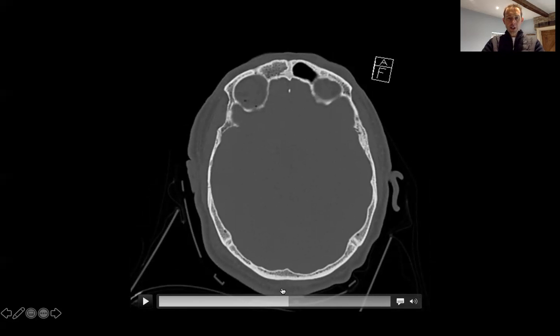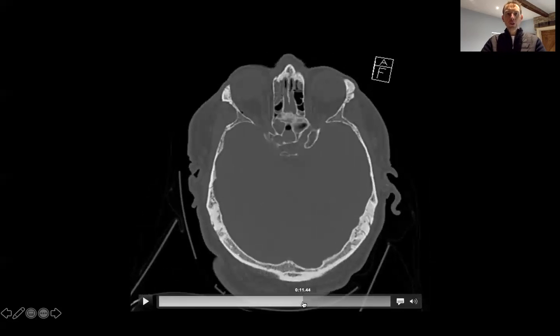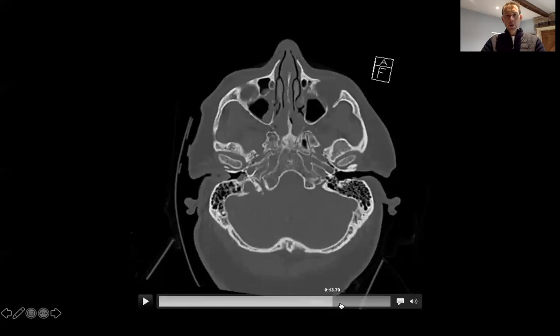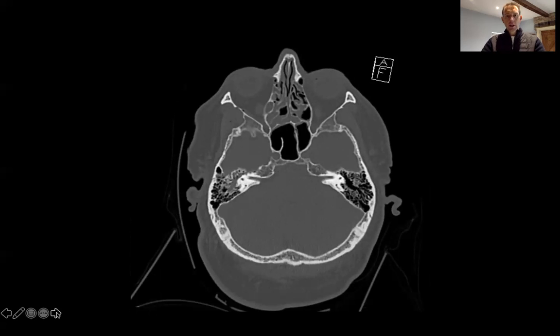This is highly suggestive that there might be an underlying extradural hematoma. And there are also other surrogate markers of fracture on here, such as gas within the intraorbital space, and also some pneumocephalus just over the edge of the petrous apex in the middle cranial fossa. So soft tissue injury is useful to help us identify and work out the pattern of injury.